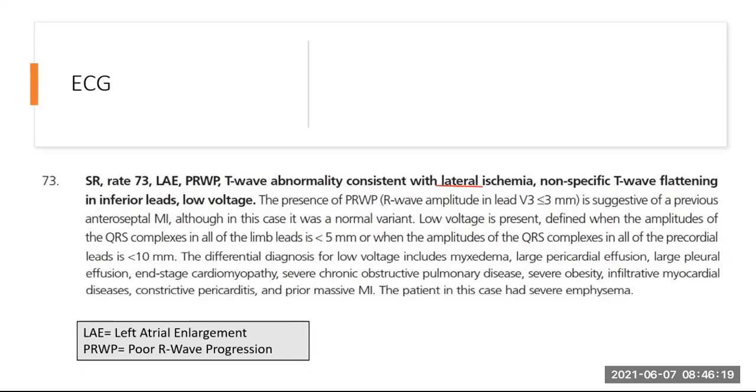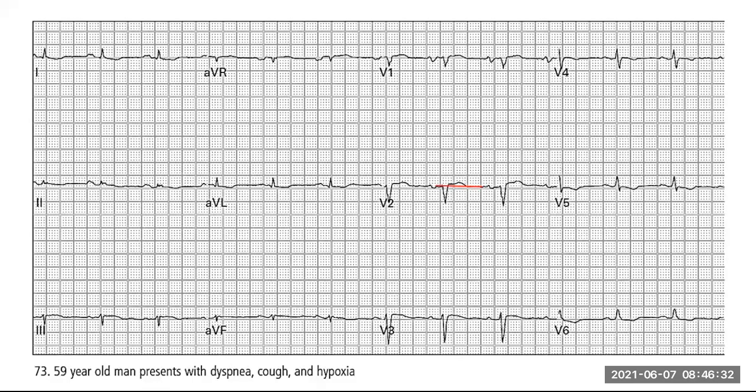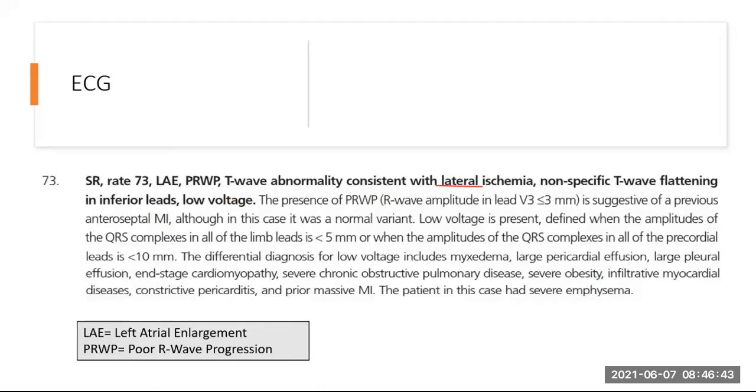Look at your ECG and compare it to when you've seen normal ECGs. You're not trying to become a cardiologist, remember that. You're trying to pick out things that you can look at. So even if you are not a cardiologist and you look at this ECG, you can say, you know what, this doesn't look right. Those QRS complexes look small. I'm going to look at the rest of the body and then I'm going to look at the heart and try and decide what's going on.